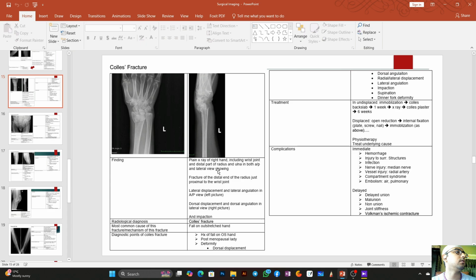And there are a lot of x-rays that can be taken in different situations of a patient's profile, but that is uncertain. But these x-rays are the basic x-rays you will see in your exam, and I think you can read the x-ray and also try to answer the questions. And also MRI and MRCP are advanced in the MCPS and FCPS part 2 exam, and they will try to hammer you and try to know your maturity by keeping you in different situations. So that is all I try to explain here.